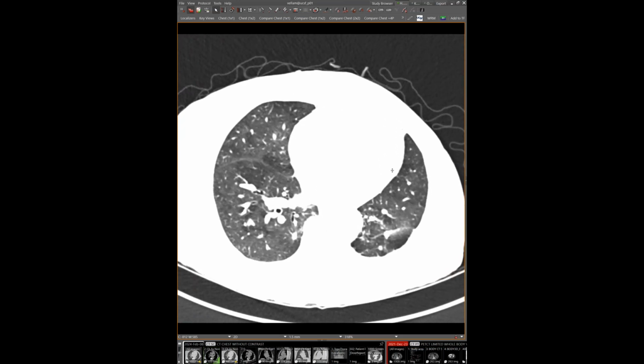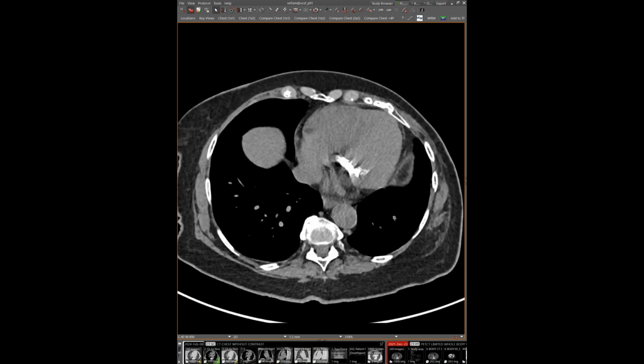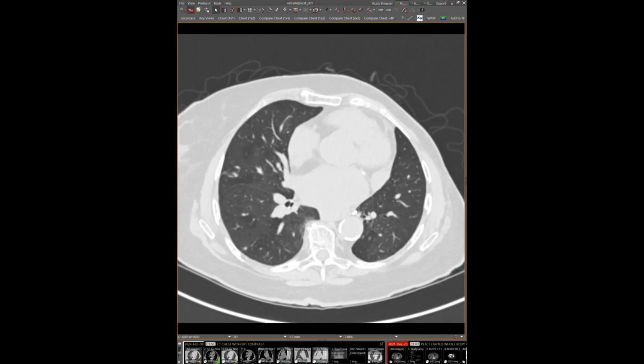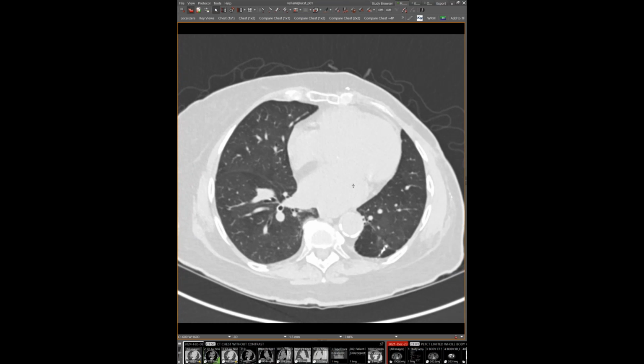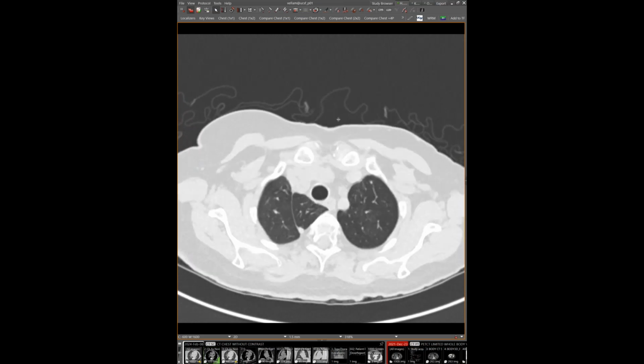And the thing that I actually thought was really interesting about this patient is you may have noticed as I'm scrolling through here that she has sutures in her left lung. And that's because she's had a left lower lobectomy because she actually originally presented back in the 90s with carcinoid syndrome. So she presented with flushing and wheezing and diarrhea, and that's when this diagnosis was originally made. And she used to have a larger lesion in the left lower lobe. We actually don't have her pre-imaging from the 90s, but that got resected, and pretty much immediately after the surgery, all of her symptoms went away. So that's the first that I have heard of DIPNECH presenting with actual carcinoid syndrome.